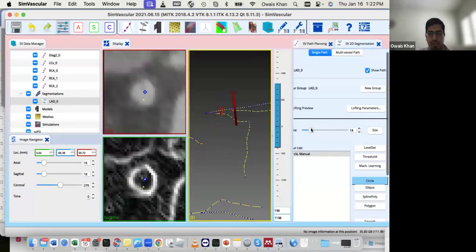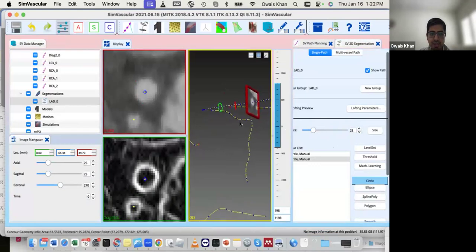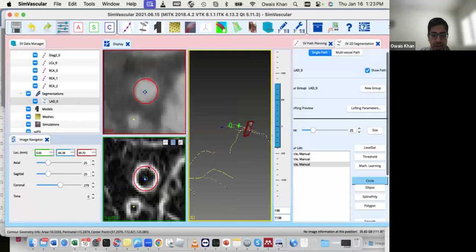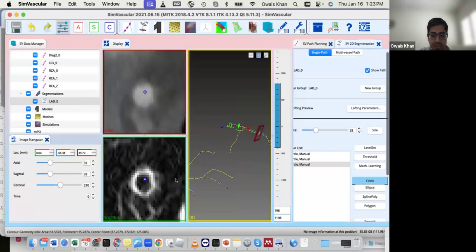I'm gonna keep moving. You don't have to draw a circle every slice. I'm gonna save, keep drawing circles right here. And then I'm gonna keep drawing circles. The reason I smooth these out is because the slicer works pretty nicely if you smooth out your path lines. If you don't smooth these out, you're gonna have lots of trouble with the slicer. So you should smooth these out.